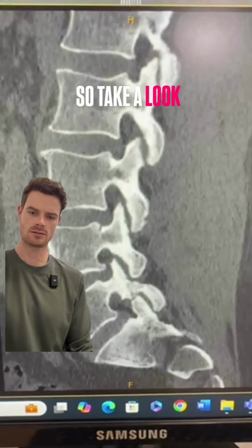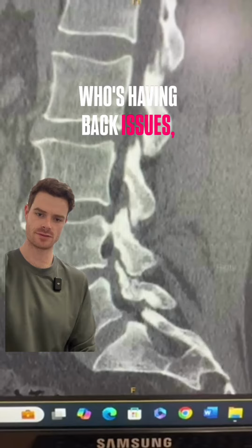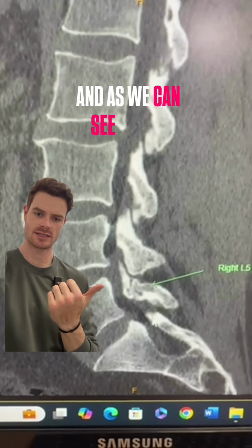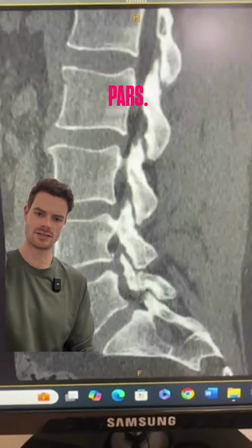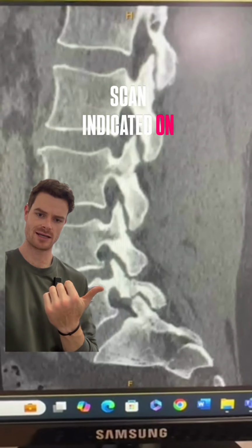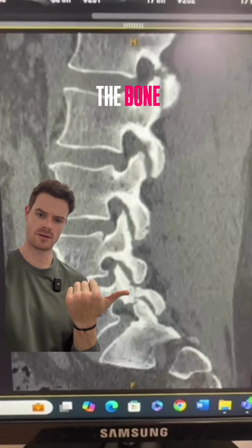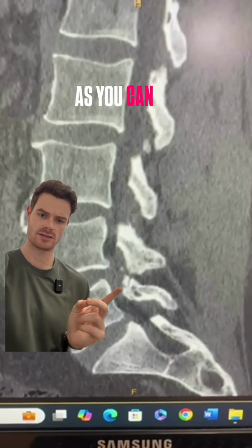So take a look at the scan of one of my patients who's having back issues, back pain. And as we can see there, that's the culprit. The right L5 pars had actually been fractured. And as you can see from the scan indicated on that end, you can see there the bone actually fractured from that end, as you can see right through there.